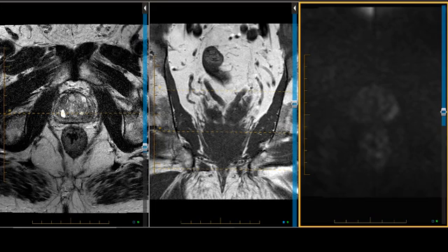And you're going to do that by size, by boundary crossing, by hypervascularity, but especially by the diffusion characteristics and the morphology of the lesion, whether it's crossing key boundaries or not.